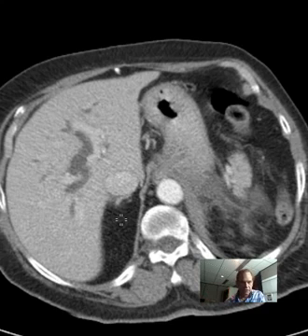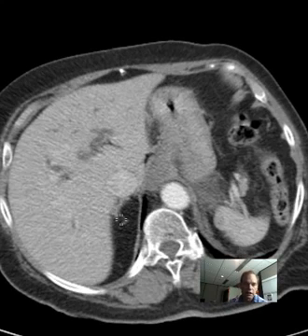The liver, spleen, a lot of these things, the aorta, all jump out at you, but for the adrenal you have to think, don't forget the adrenals. That's what one of my professors taught me. Javier Casillas from Mexico. Don't forget the adrenal gland.